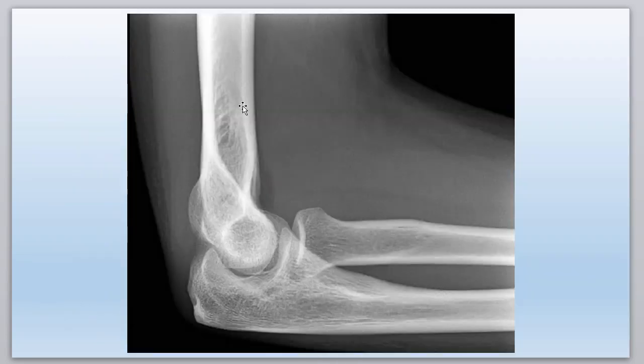Okay, so still on the elbow, this is a lateral view, nice lateral shot, 90 degrees here. So this is a decent projection here. So now you can see a nice notch here. So that's the trochlear notch. This whole piece right here would be the olecranon process, all of this material. Here's the head of the radius again, shaft of the radius. It looks like there's a little bump right there. It's not that impressive, but that is the radial tuberosity.